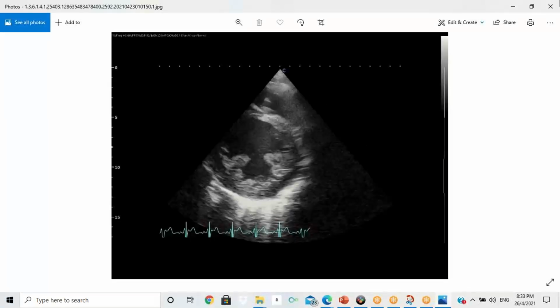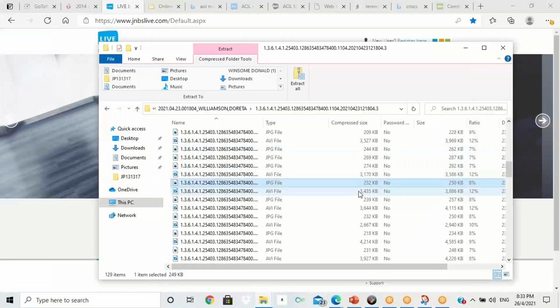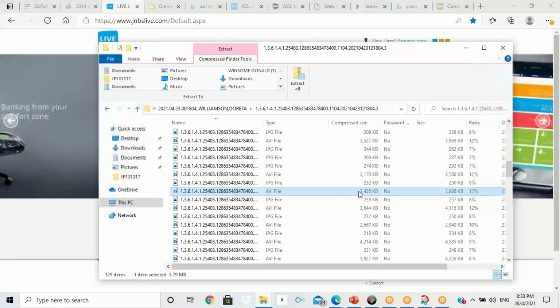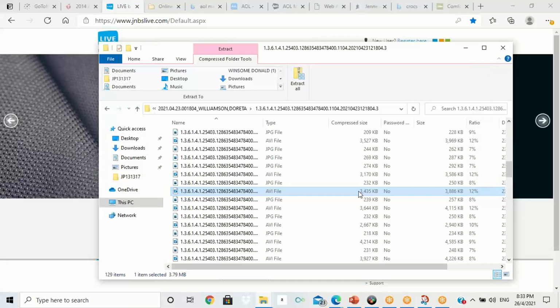Again, so this is a still image. This is the mid segment of the heart. So we look at the base where the mitral valve is. At the mid segment of the heart, remember this is short axis. You bread loaf the heart. You lay the heart on the table and you bread loaf it like you would cut a loaf of bread.